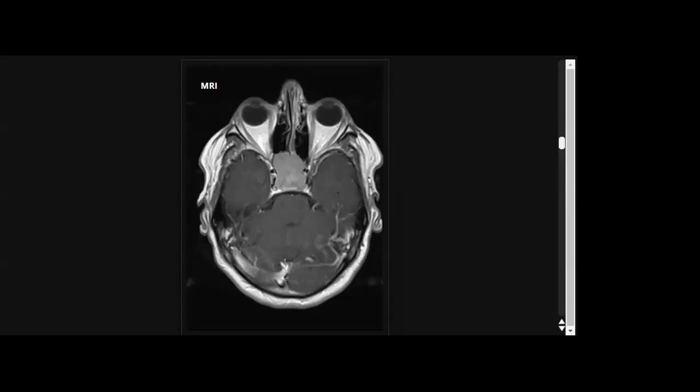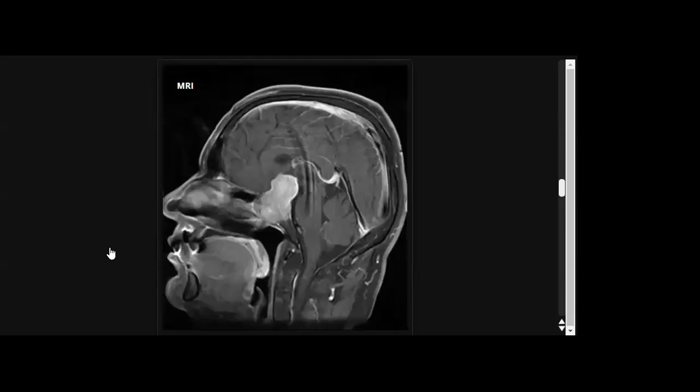But I agree with you. We will use other planes like coronal and sagittal, looking for what? I'd look for the base, the ethmoid. Any dural base, any dural enhancing dural tail for meningioma.